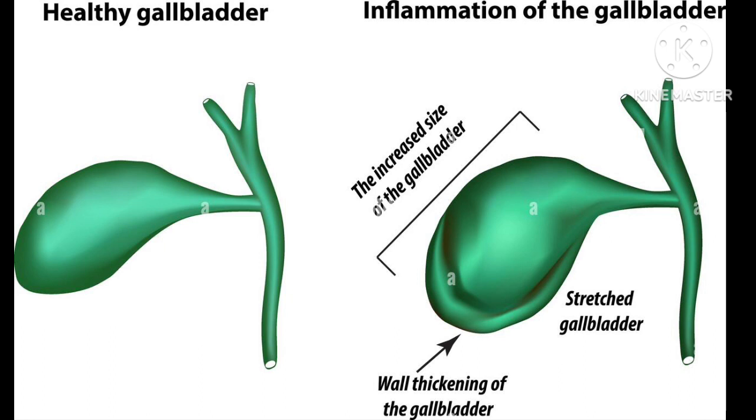In other words, you can say in a distended gallbladder, the length should be more than 10 cm, diameter should be more than 5 cm and wall thickness should be more than 3 mm. Regular and symmetric increased thickness of the gallbladder wall is in favor of inflammation. Irregular and asymmetrical increased thickness of the gallbladder wall is in favor of malignancy.